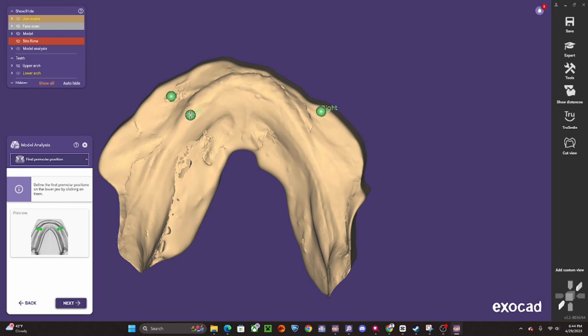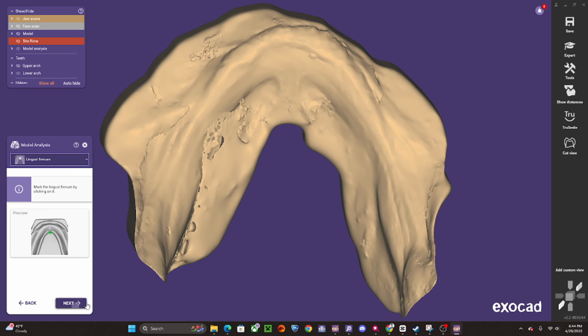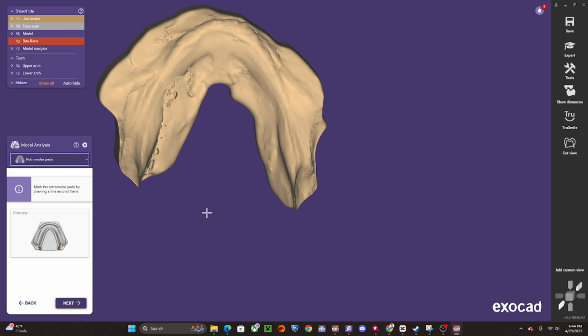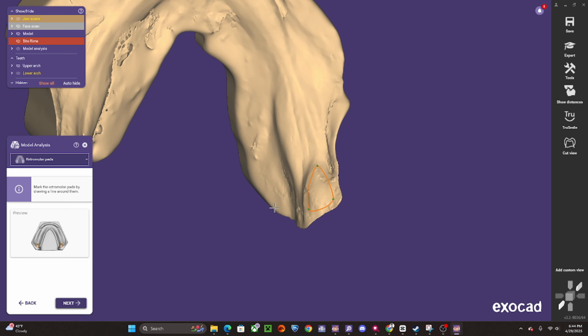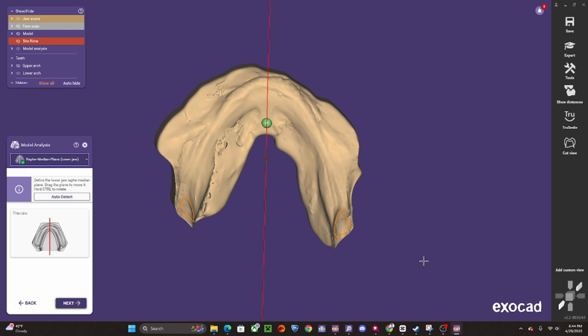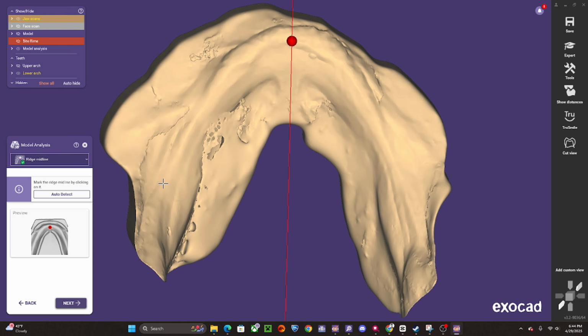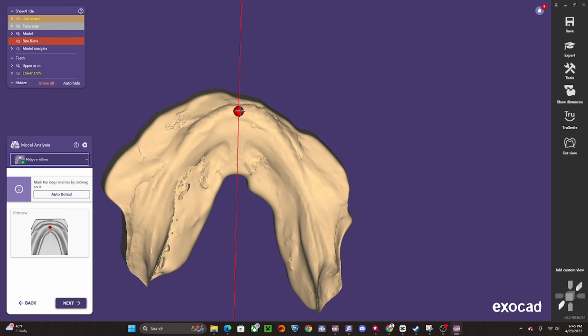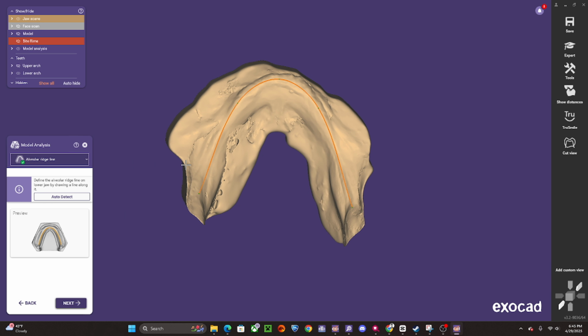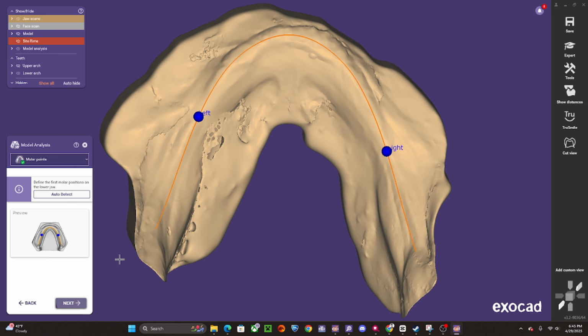And then also our premolar position on the lower arch. And now our lingual frenum. Retromolar pad on the lowers. We gotta mark 3 dots on each side. And then our median plane should replicate the maxilla's. And now we have our ridge midline of where it is on the ridge. So I like this one right here. And then this labial surface limit, I'm going to bring that to about there. So with our alveolar ridgeline, it kind of marked it very nicely, and I'm happy with that.